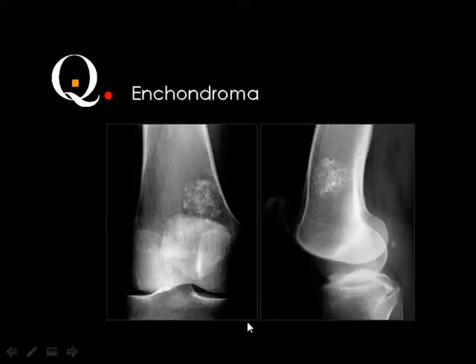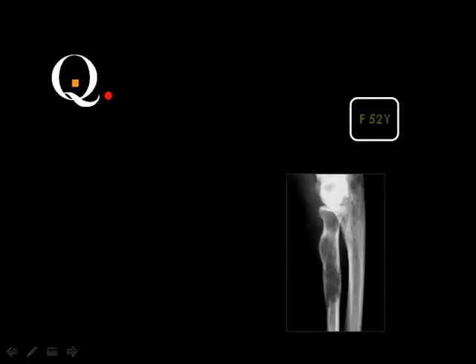Enchondroma, yes. A bone infarction is like the Chinese figures. Yes, you remember this. This morning we said the bone marrow infarctions are like the Chinese figures. This is a cluster of calcification which is classic for an enchondroma. What do you think of this radius? Benign or malignant?